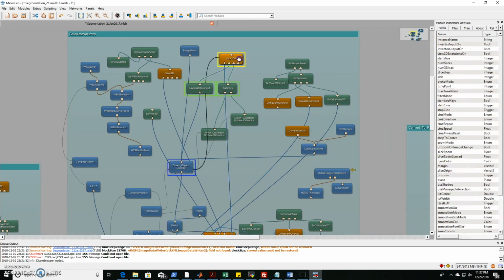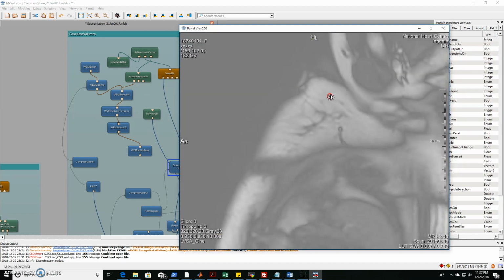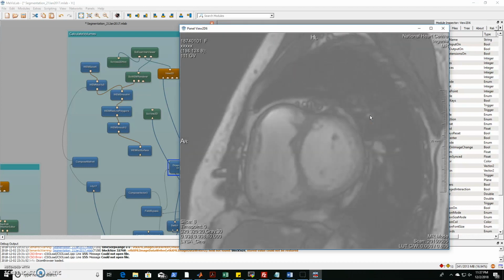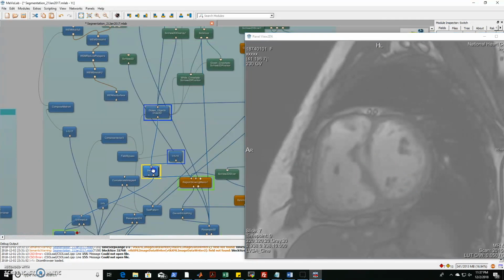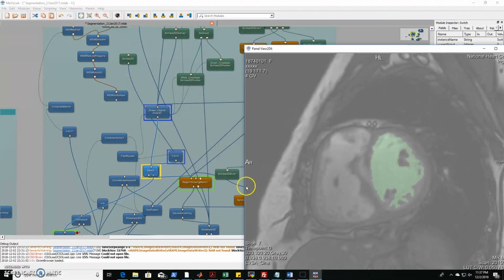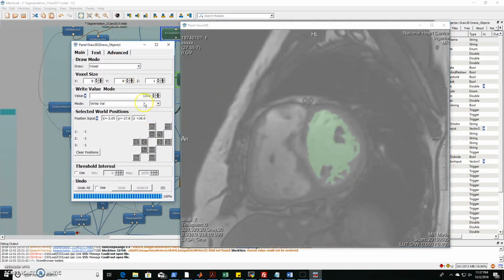Then we're going to go up to view 2D6. This is the same thing. You can change the brightness to your liking, and then you can see the different files here. Now what we use is Draw Objects 3D. If you open that, another pop-up window shows up.